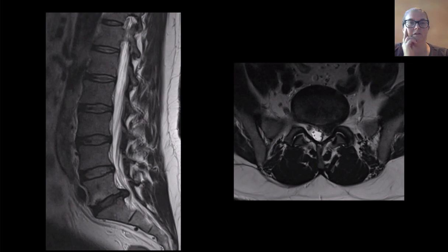The other thing that I look for is flow voids in the spinal canal. We've had a few cases where on the lumbar spine, you can actually see the flow voids in these big vessels in cases of spinal dural AV fistula. So have a look there. And then typically I go level by level. Ideally, your MRI is going to include probably from about T11 to the mid to lower sacrum. And I might just get the lower thoracic spine on SAG images, and I'll say, based on the SAG, there's nothing or there's a small disc. And then I go level by level.